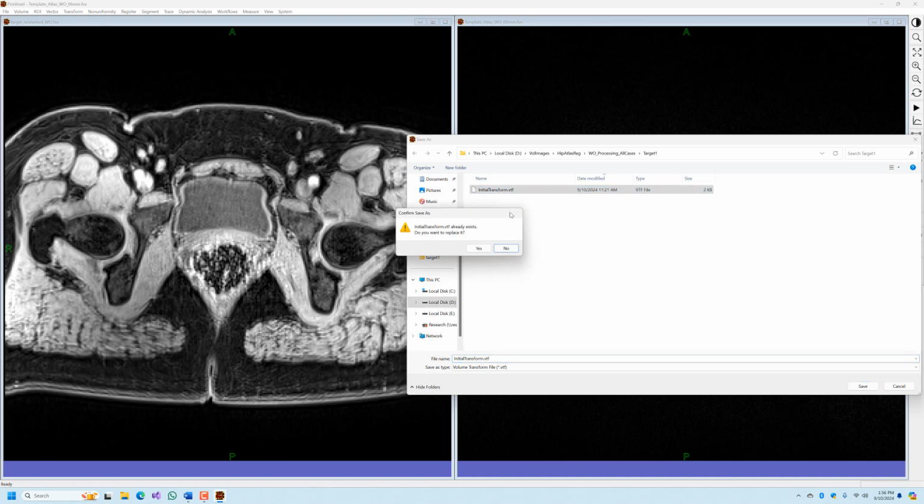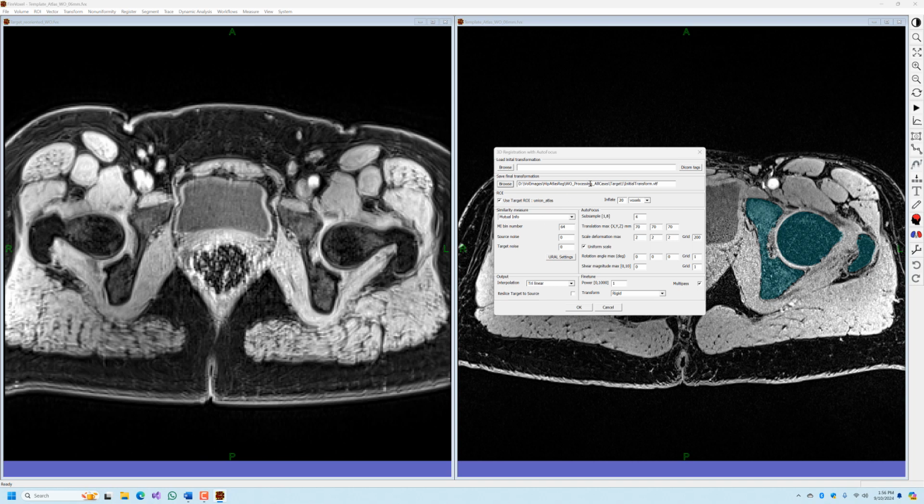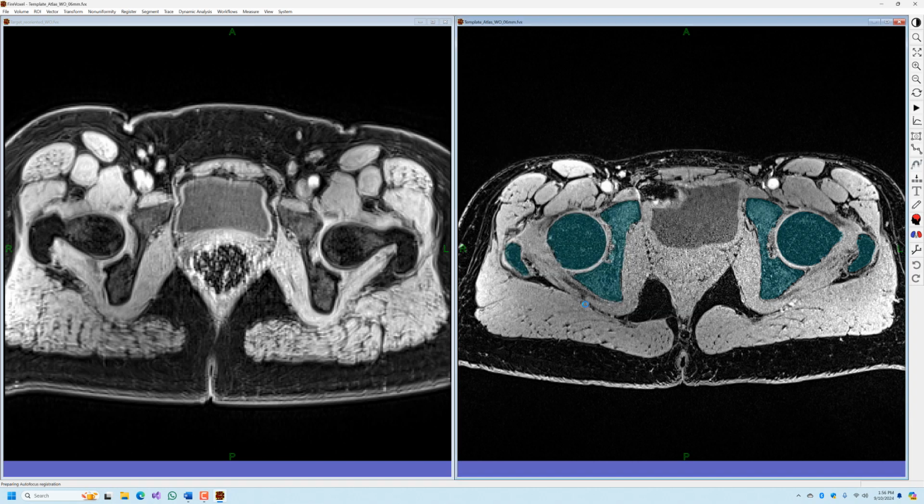So we need to specify the name for that affine parameter, and then we press OK. Just use the default hyperparameters in the dialog box. You don't need to change anything. Press OK, and now the processing runs.